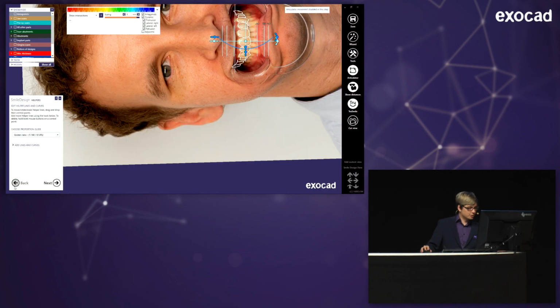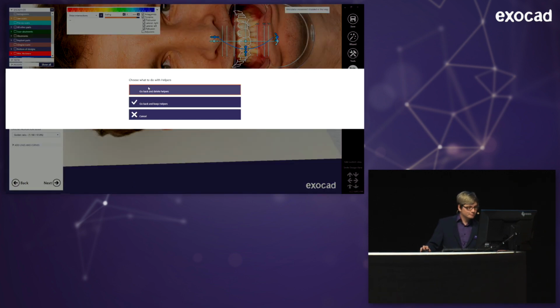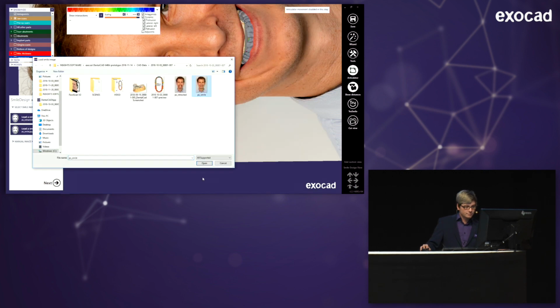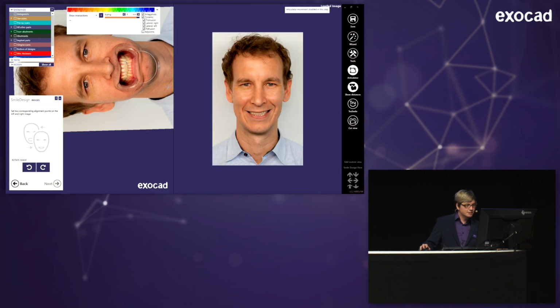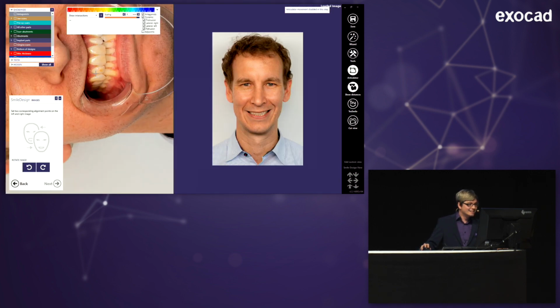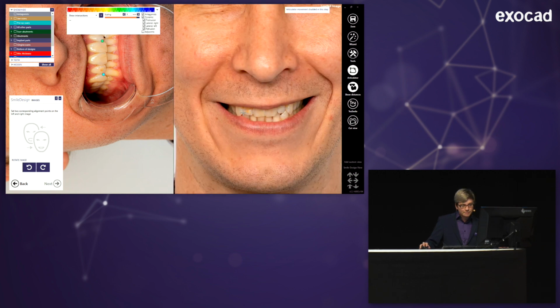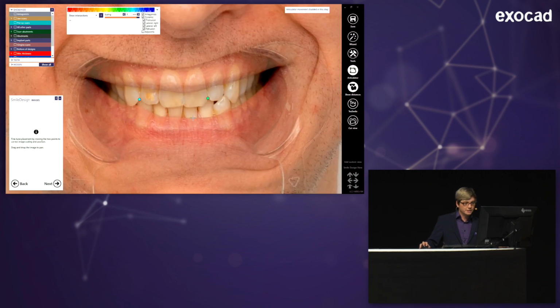Oh, I'm sorry. So that was a good case, yeah, really great work from me. Yeah, as you've seen, I clicked on the picture on the wrong point and then didn't delete the point, but just kept clicking, and that was the mistake. But in this way, it might now work.